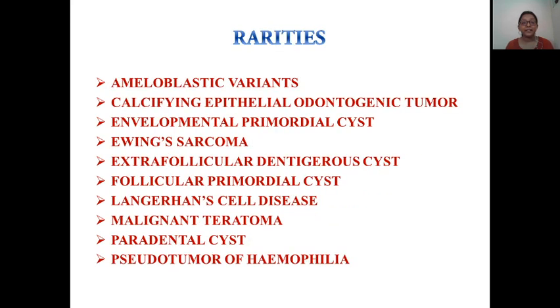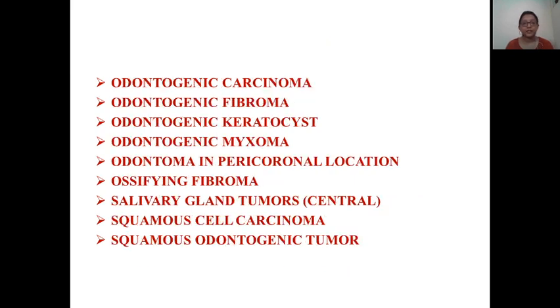These are all rare varieties of pericoronal radiolucency, and the most common were described earlier.